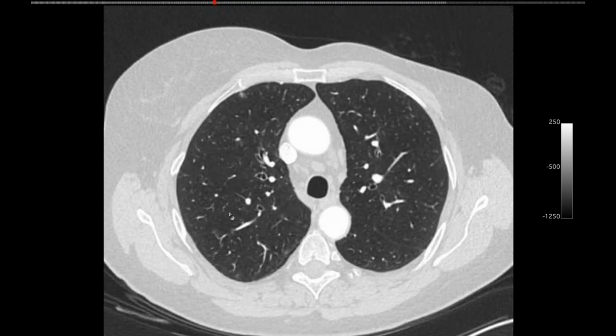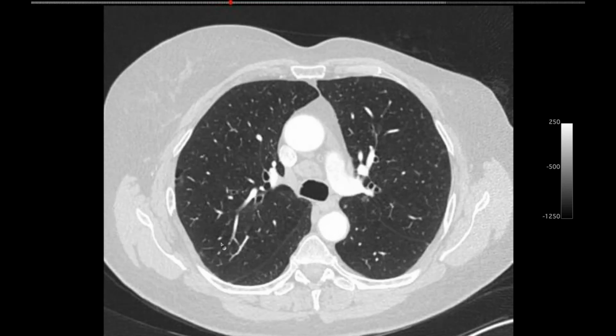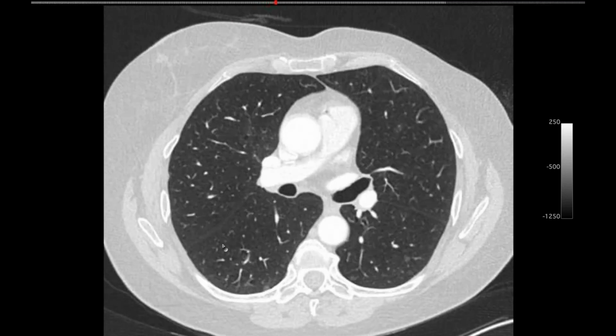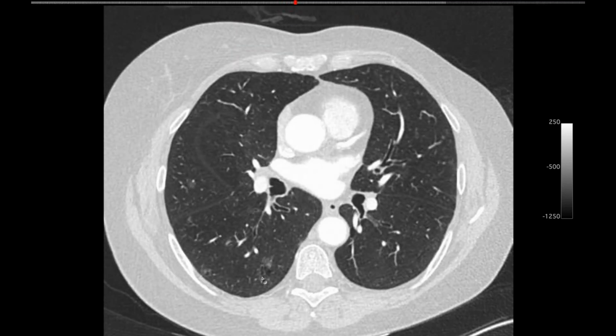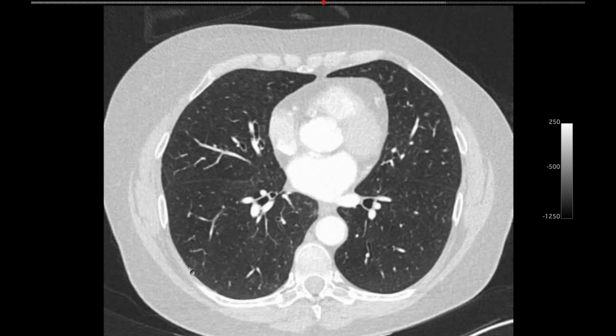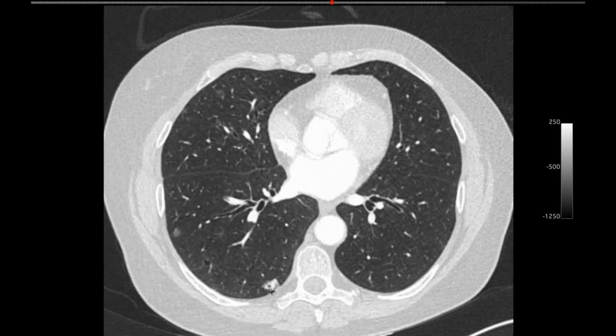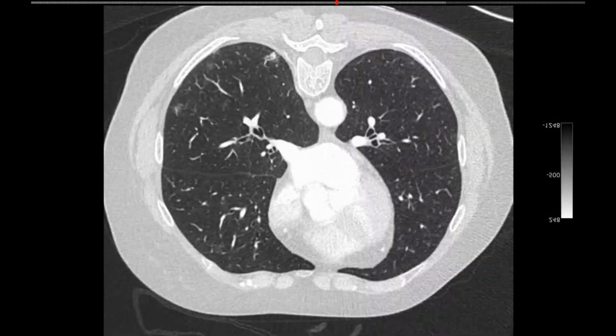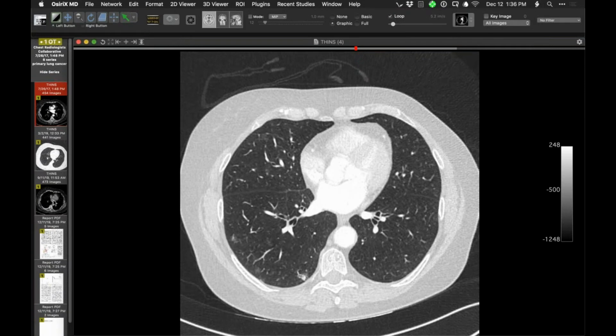Yeah. There are so many focal ground glass attenuating lesions throughout the lungs, every lobe, every place, in addition to these interesting lesions that we call pseudocavitation, and in addition to these larger solid lesions here and there. So that's exactly the case. So that's in 2017. It's been a dilemma for a while.